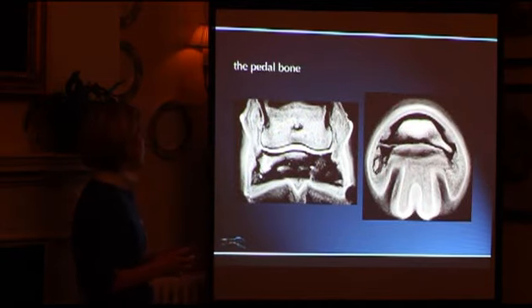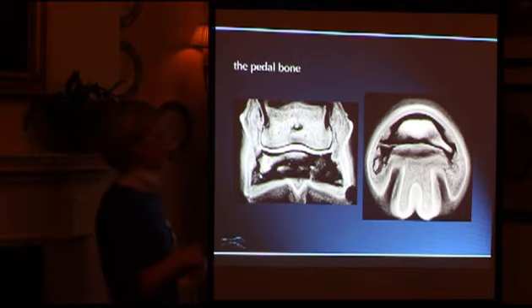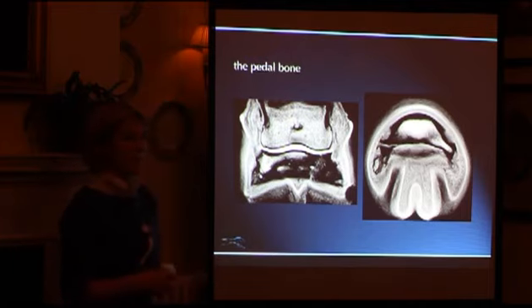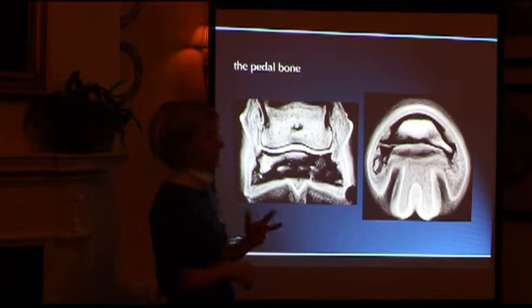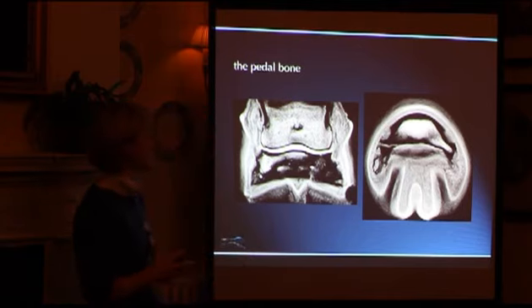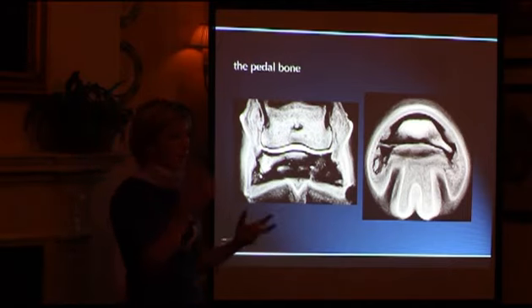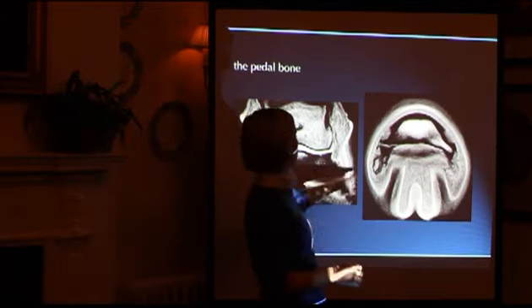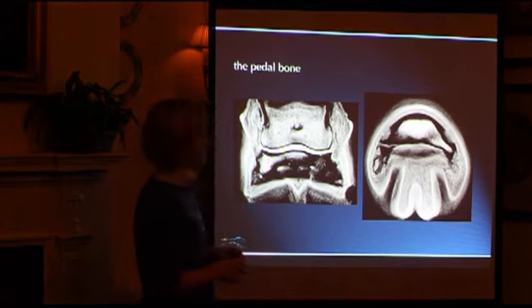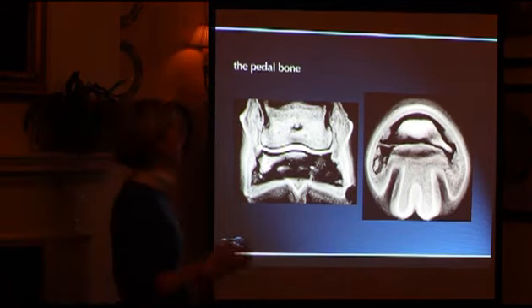The pedal bone, there are obviously a number of pathologies such as cyst-like lesions, which we can detect on X-ray, or we thought we could until we started MRIing horses and finding cysts where we didn't appreciate them radiographically. But it's really good also even for conditions where you have a radiographic finding in the pedal bone. So both of these horses have fractured their pedal bone, which you'd see on an X-ray. You'd know what to do. You put a bar shoe on it, you put it in the box.